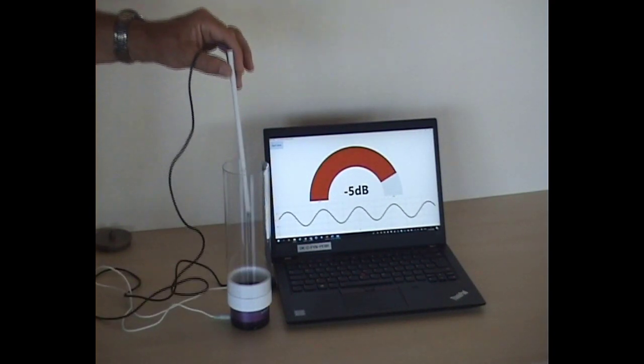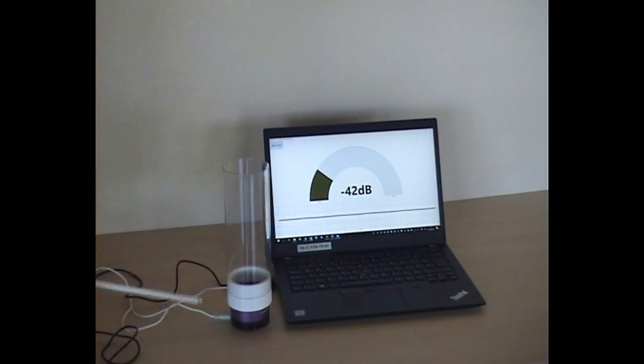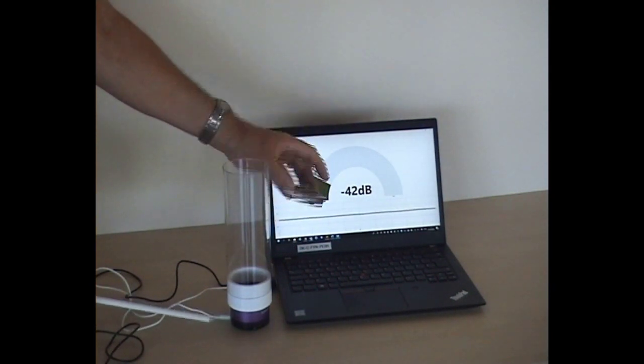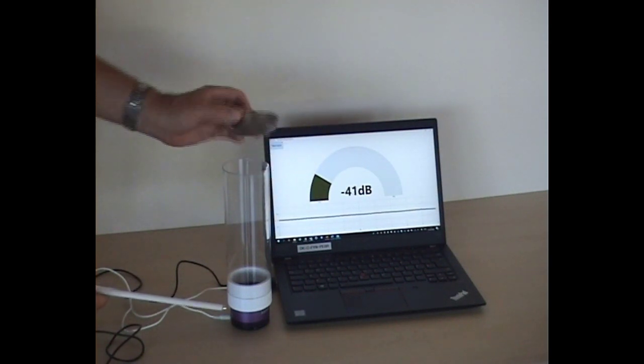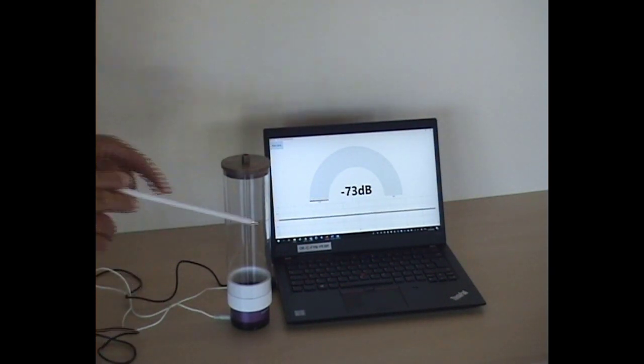So now for the final part of the jigsaw puzzle, and even more imagination required. So I've actually 3D printed a tympanic membrane here with a small hole in it, which allows us to put the microphone into the ear canal, kind of from the cochlear side, the middle ear side of the ear canal.